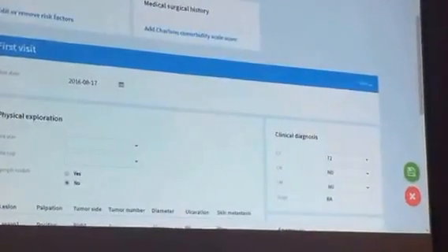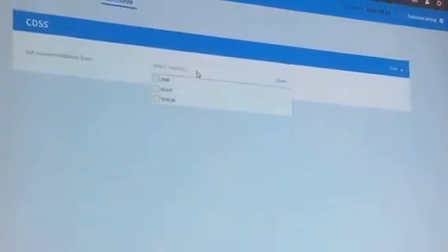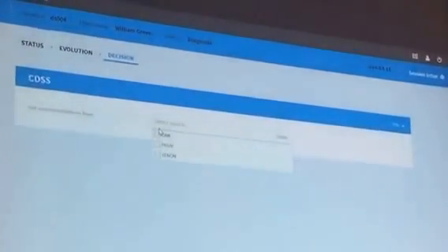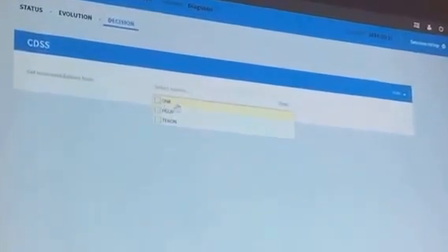So if we go to the decision-making process, we can choose which kind of source we want to know, so from which kind of guidelines, a priori, we want to get the recommendations. So here we can have local ONC, which means Oncológica, a clinical partner that is involved, and these are local guidelines, but we could also use other guidelines or just one guideline.